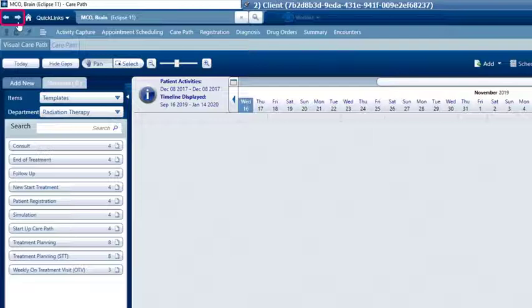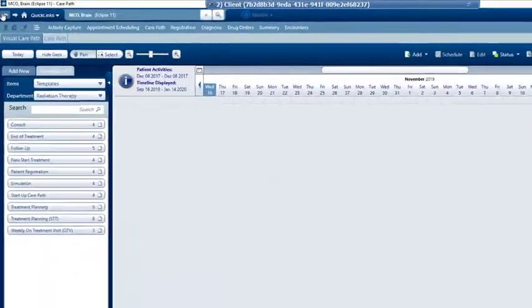Similar to website navigation arrows, there are now forward and back arrows that allow you to go back to a previous workspace. When hovering over the right or left arrow, a tooltip will appear listing the previous workspace. Clicking on the arrow will change to that workspace with the same patient and context.